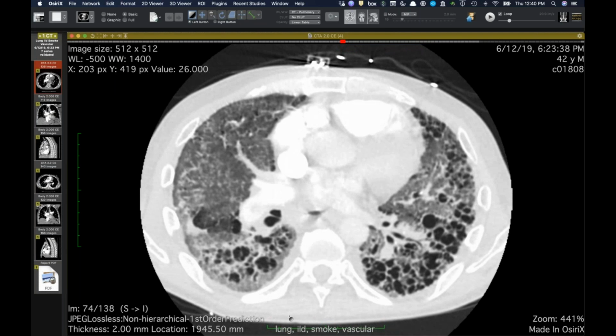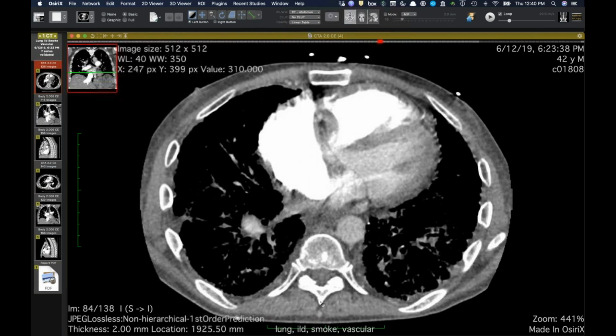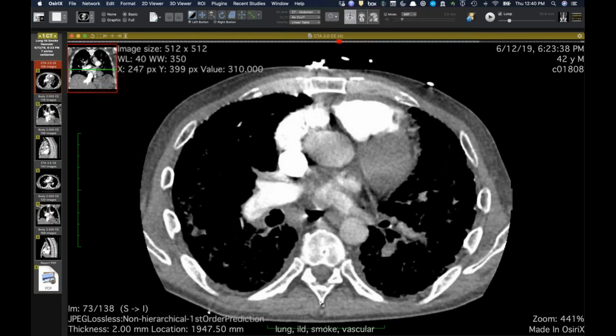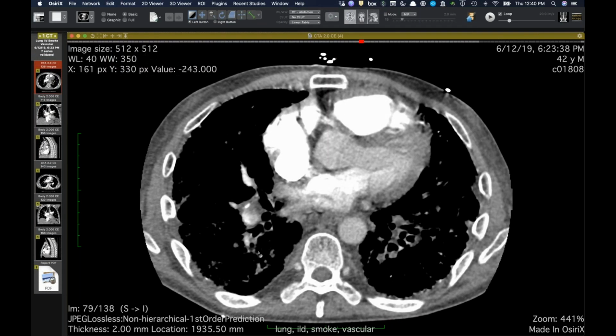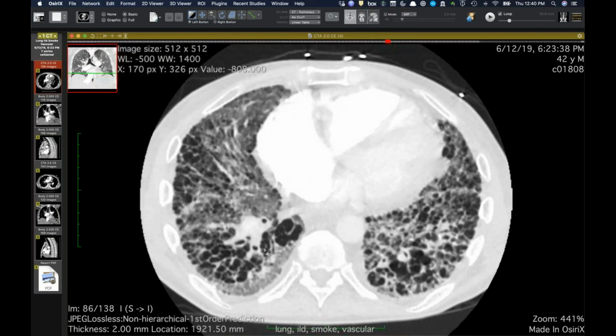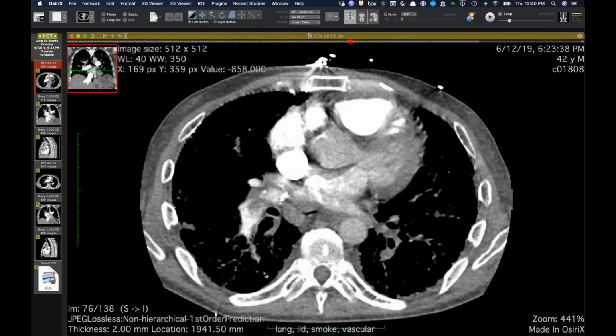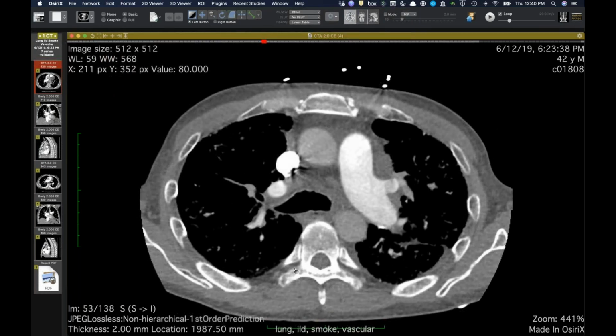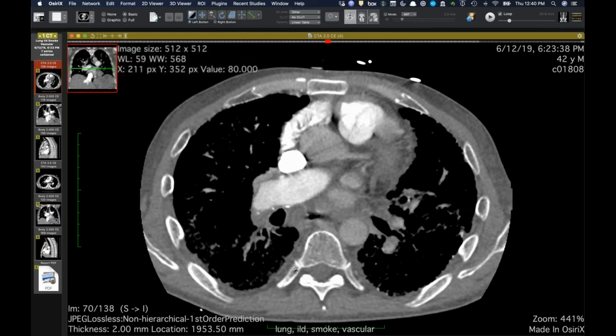So the smoke may be a combination of slow flow, but maybe also anastomosis between bronchial arteries and pulmonary arteries. Yeah, exactly. And also slower flow in the lower lobes where you have more severe fibrosis, so increased vascular resistance there, and just early timing, like we said.